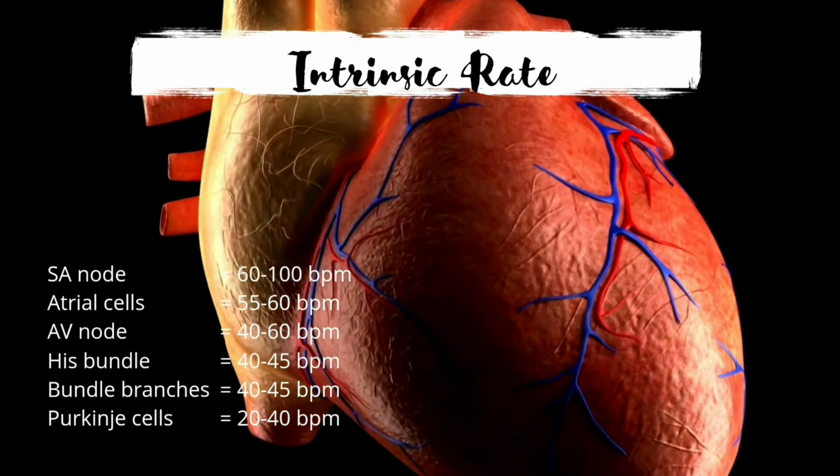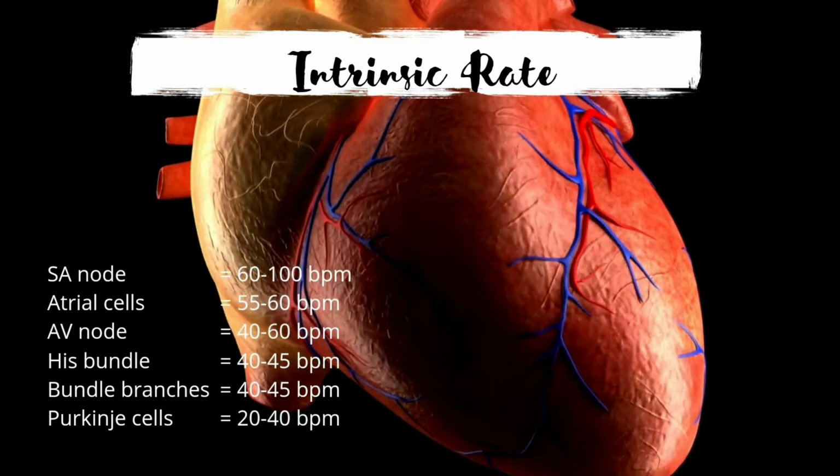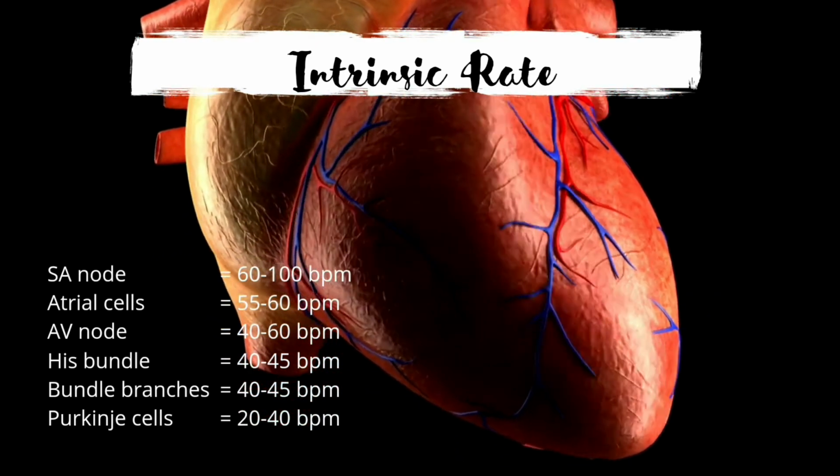In case of heart blocks, we will have an idea of where the block is located, depending on the heart rate.